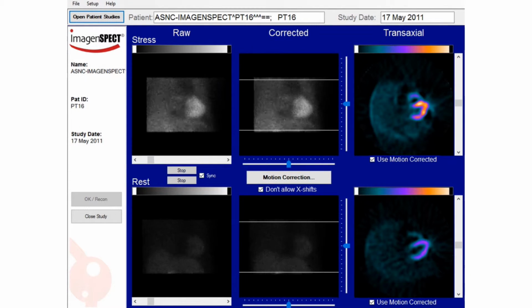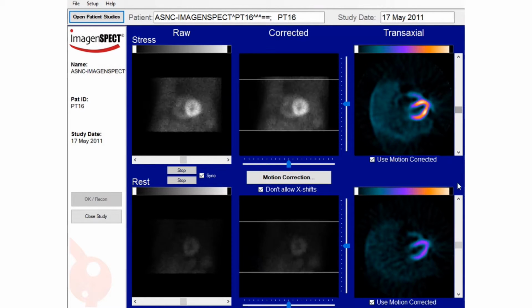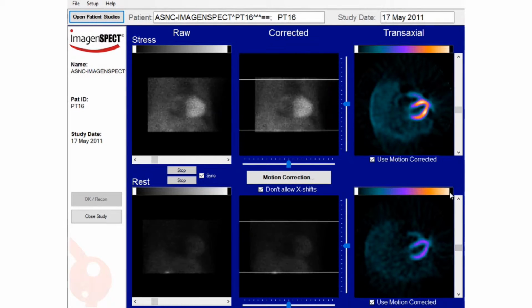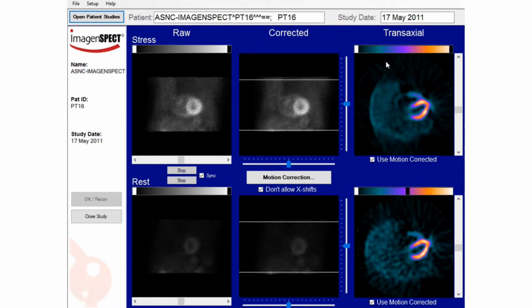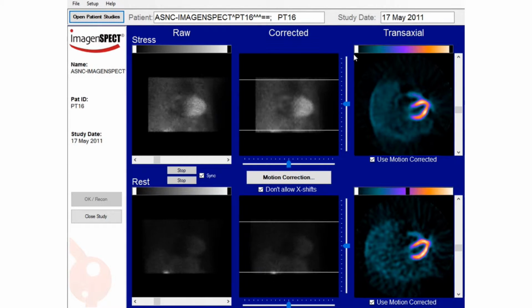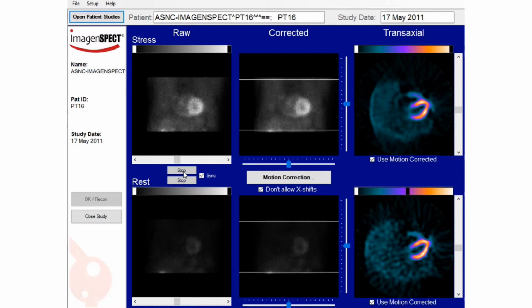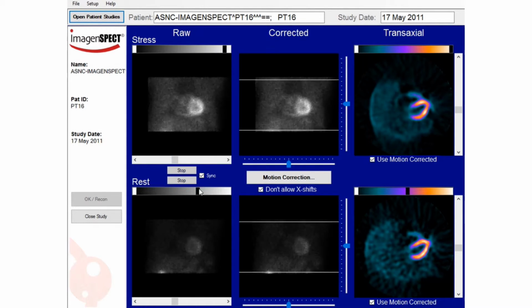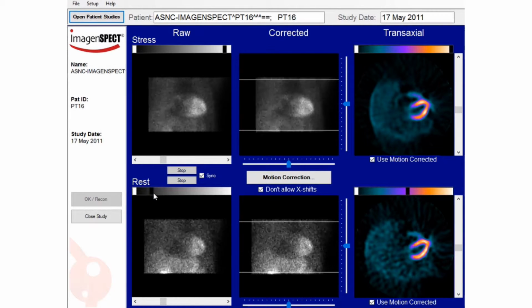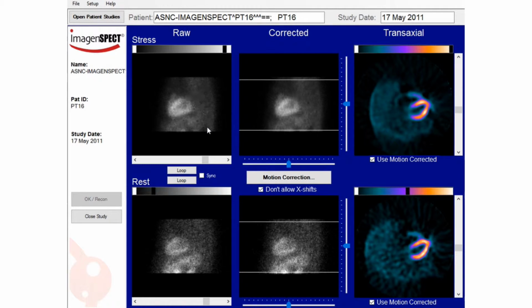In 2016, Cardiovascular Imaging Technologies introduced a software solution for half-time, half-dose imaging on conventional nuclear medicine systems. The ImagenSPECT solution runs on a customer's own PC. This allows the user to pick the hardware platform that best works for them and meet all of their in-house system security needs. ImagenSPECT is compatible with most DICOM-based acquisition systems, and in many cases replaces the original processing workstation completely. ImagenSPECT is also compatible with certain proprietary data formats, such as the Pegasus format.